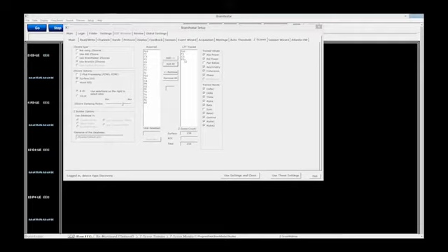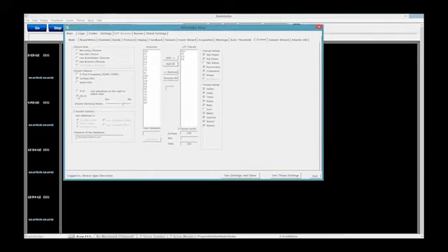Once again, you're going to have to tell the software you want to do 19 channel Z-score training. On this screen, under Z-score options, you have to choose between 4 channels and 19 channels. Once I hit 19 channels, then I hit add all. Now I'm going to get all my LZT trained over here. So now I'm at 19 channels, and life is going to be good.